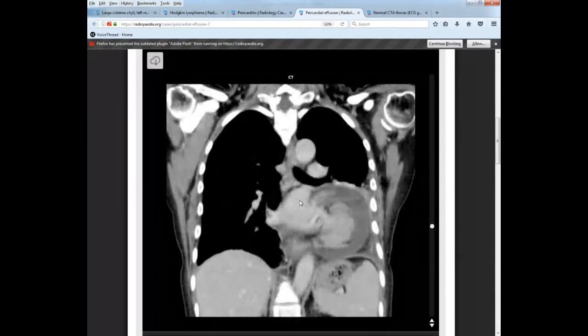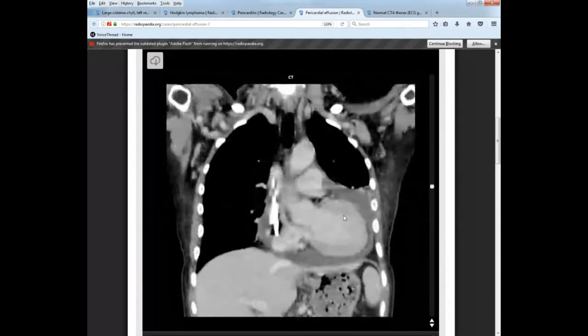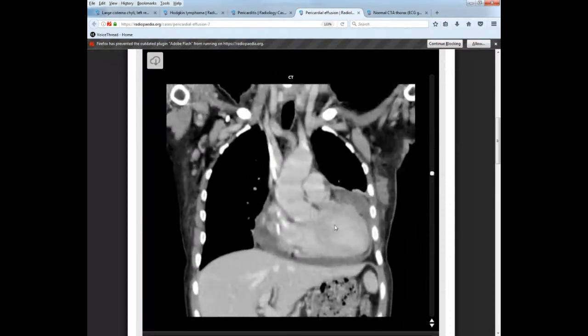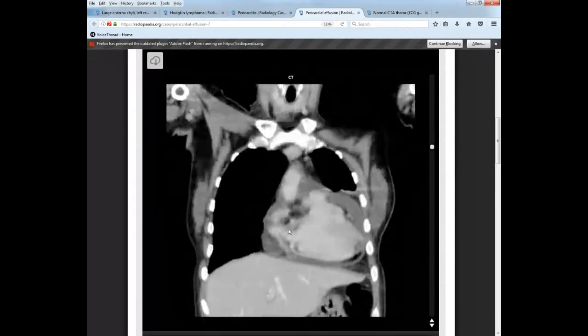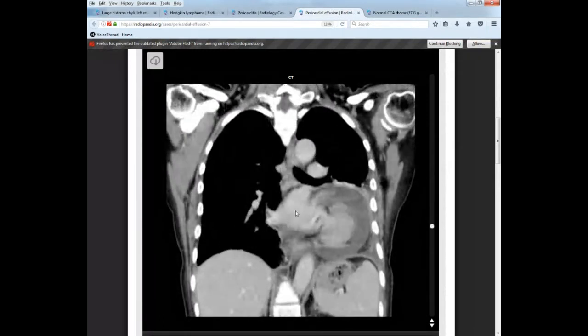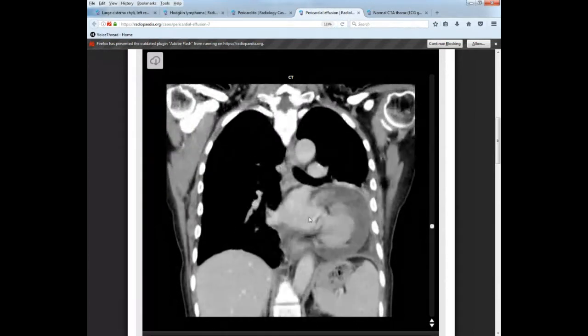Moving on to the specific chambers. Okay, I already mentioned left ventricle is the most inferior, posterior. As we go anterior, you need to see the right, it's hard to see on this slice, right ventricle.